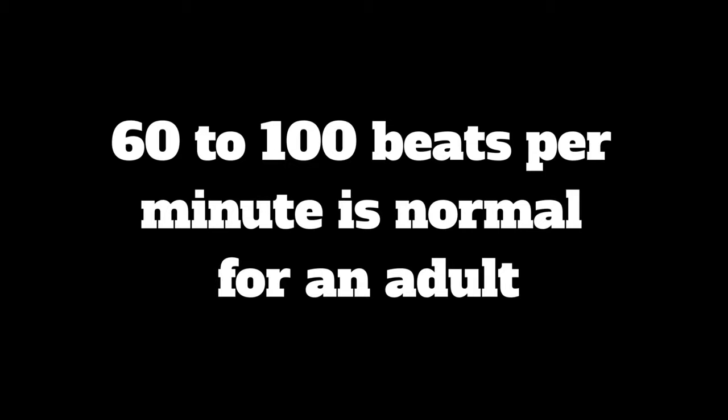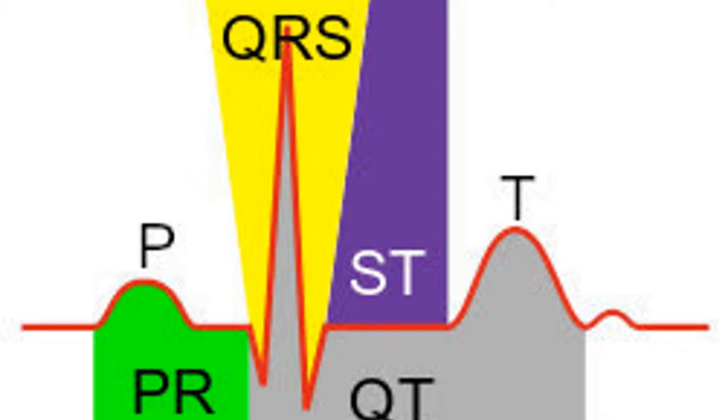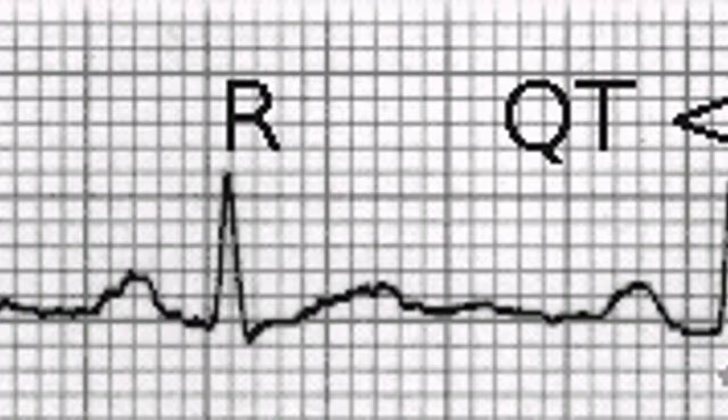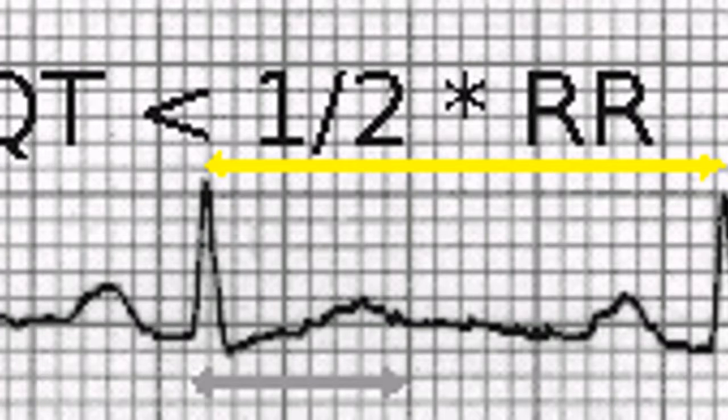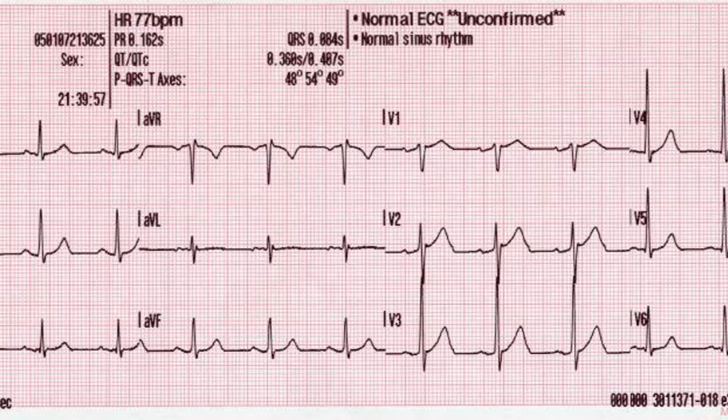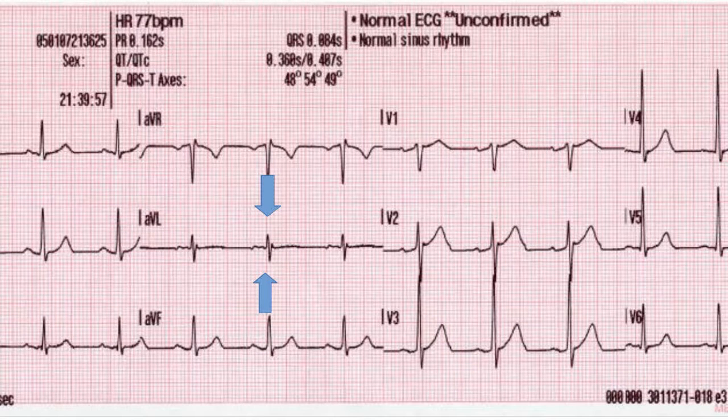Do you remember what the normal heart rate of an adult is? 60 to 100 beats per minute is normal. Correct. So, if your patient's heart rate is faster than 100 or slower than 60, then call Dr. Sutton. Let's look at the background grid on Mr. Epstein's ECG. Let's count the R waves. Do you remember from class? The R waves are any upward peak. R means one heartbeat. Counting R waves on the rhythm strip will let us calculate the rate without a ruler and a calculator. Lead 2 is the best.